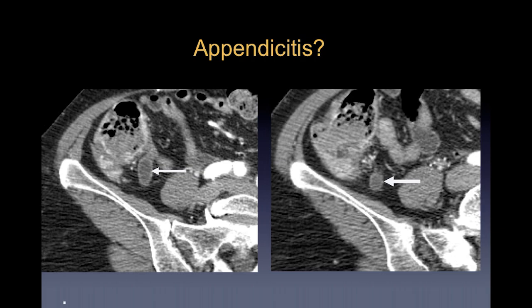Here is an example where it didn't quite work. This was a patient who came in for some totally other purpose, and we saw this appendix that was quite distended with airless fluid, and on the basis of that, questioned whether the patient could have acute appendicitis. This patient turned out not to, so that's the 1% of cases where you're going to see it just incidentally.